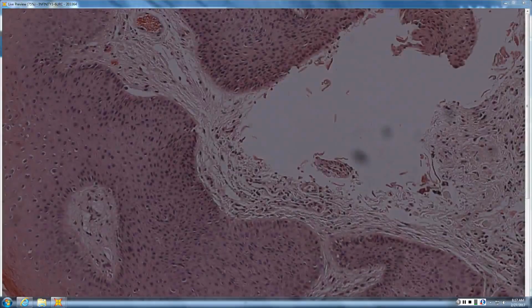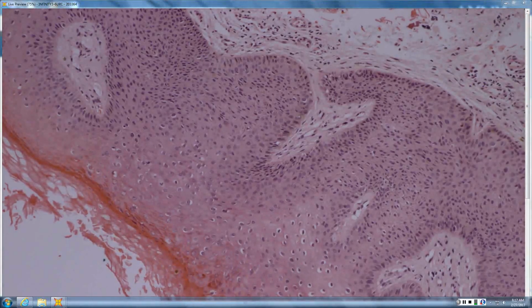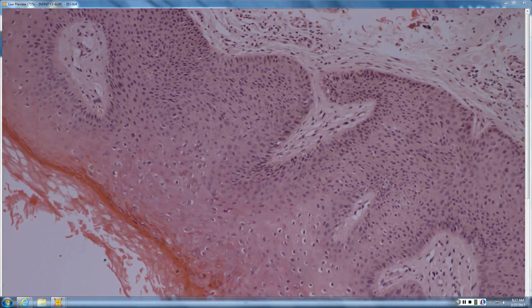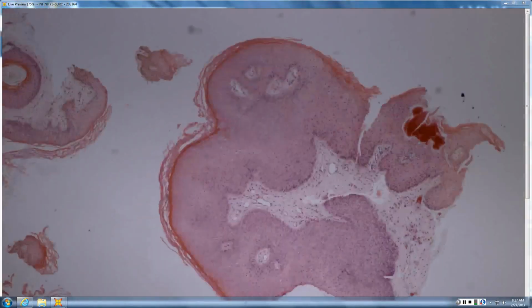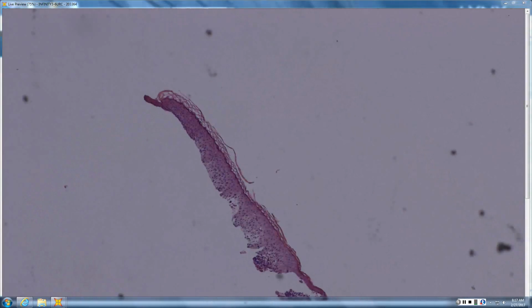So this is a mammillated surface. Yeah, mammillated surface, and what do you see here? I see some warty change again. Yeah, and tell me about your corneum. It's got those punched out little areas in it. Yep. So I feel like I've gotten condyloma or genital warts the entire time. That is exactly right. I'm getting it. The expert. You're just stamping out disease right and left. And an extra modifier now. Well, I mean, that's what it is.